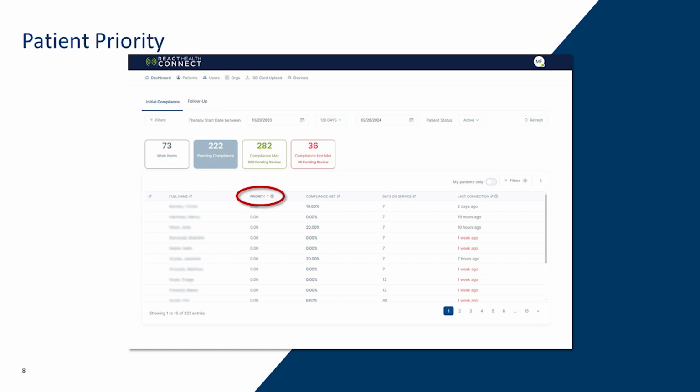After initial patient setup, you may see patients with NC in the priority column. This abbreviation stands for Not Calculated. This will be shown on new patients, as React Health Connect applies the Enso Data AI to the first few days of data as it is received from the device. The priority score allows you to focus your time and attention on those patients that need assistance in the form of an outreach.